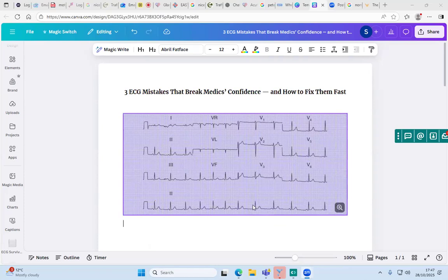However, it looks like the RR interval widens in the later segment. But the PR interval is the same. It's just the RR interval that is different. The QRS and the P morphology are the same across the board. So this is looking like a sinus arrhythmia already to me. The QRS is positive in lead 1, positive in aVF. This is a normal axis.